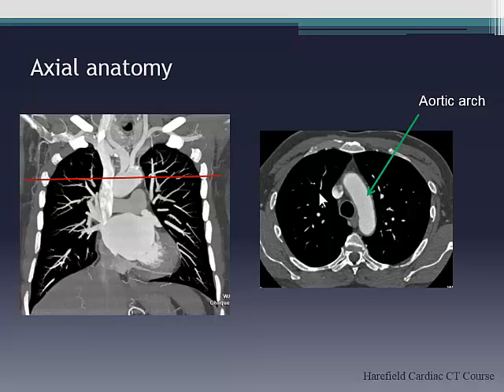In the same way, your most posterior cardiac structure should always be your left atrium, yeah? Think about it. The left atrium abuts the esophagus. So for those of you who see EP procedures, esophageal injury is one of the worries of our EP colleagues because it's slap bang against it.